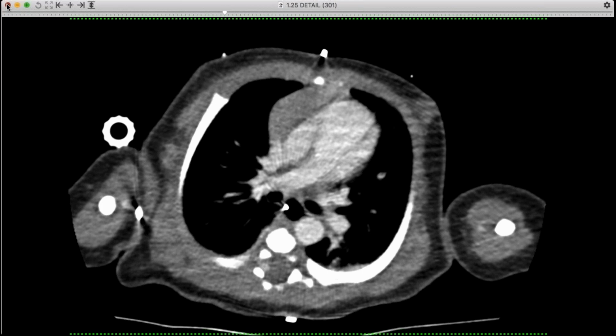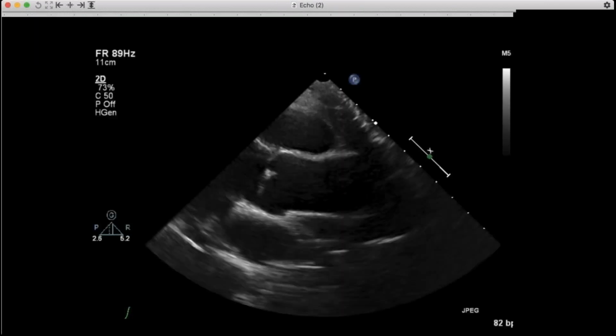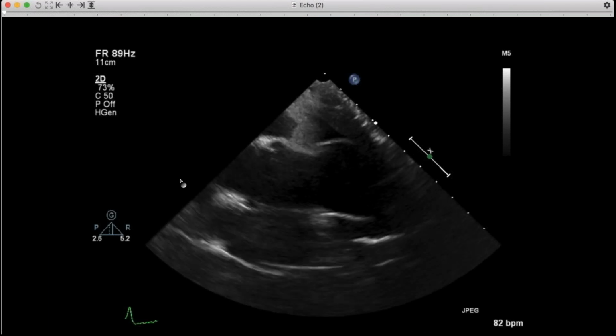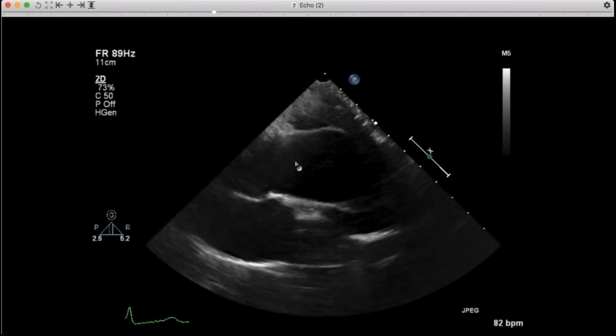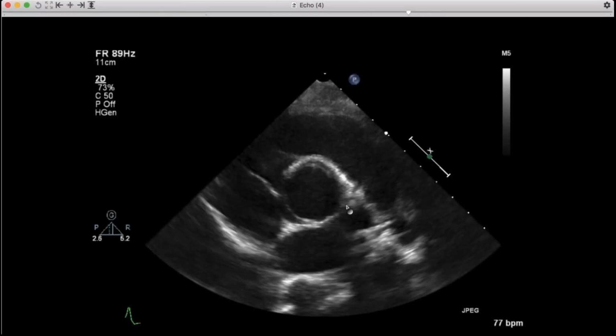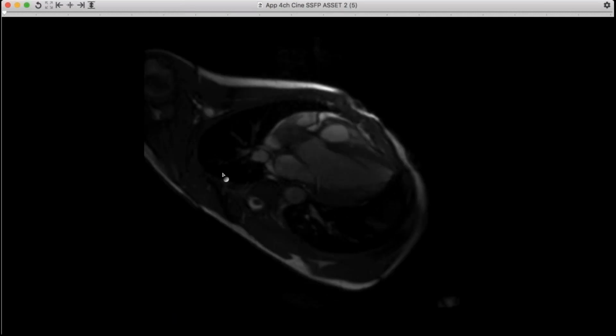And this is more interesting, at least I think Seth would like this case. So this is a 13-year-old who has a known aortic valve problem. And I've got the echo here. I'll see how well it shows it. You can see this is supposed to be the aortic valve here, and they don't label them well, but here it is in cross section. It's too fast. I'll just show the MR images. I think these show it best.